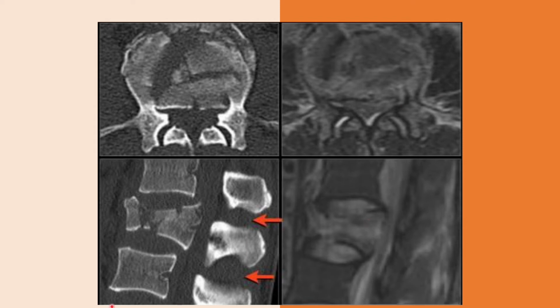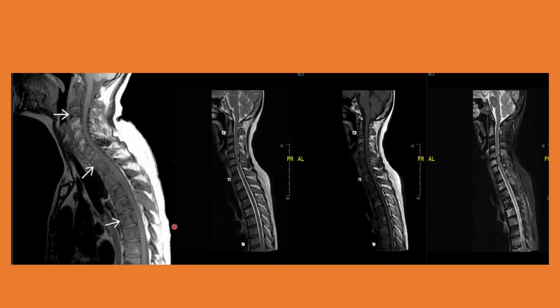Now let's look at, apart from fractures, what else can B or bone signify? So here is a sagittal T1 weighted MR, which shows patchy hypointense replacement of the fatty bone marrow both in the cervical and the thoracic spine, with the disc still appearing brighter than the adjacent marrow. Now, these are very typical of diffuse metastasis. So, when you interpret B, you should look at not just for fractures, but these signal changes as well, which can actually tell you that there is some pathology going on.